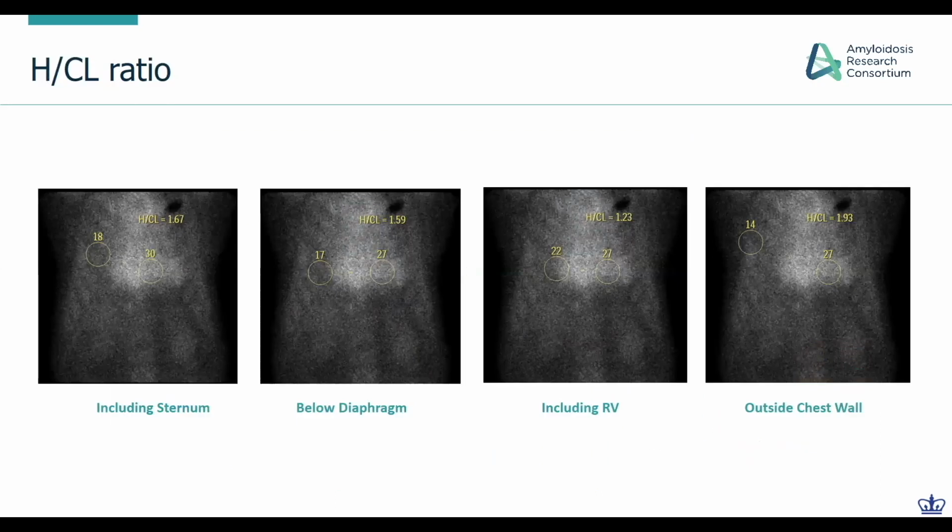Another very important thing: these are different examples which I'm showing you for the same patient. This is how they draw the heart to contralateral ratio. It only takes a minute to draw. What I suggest to the physicians in our lab, the nuclear cardiologists who are reading it, is to draw it themselves. Or you can have a very well-trained technologist do that.